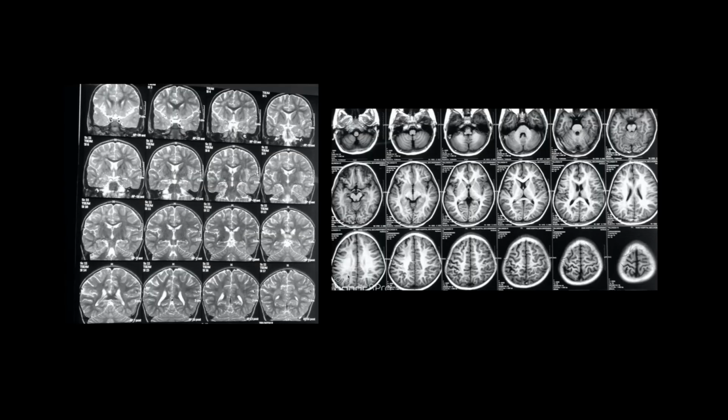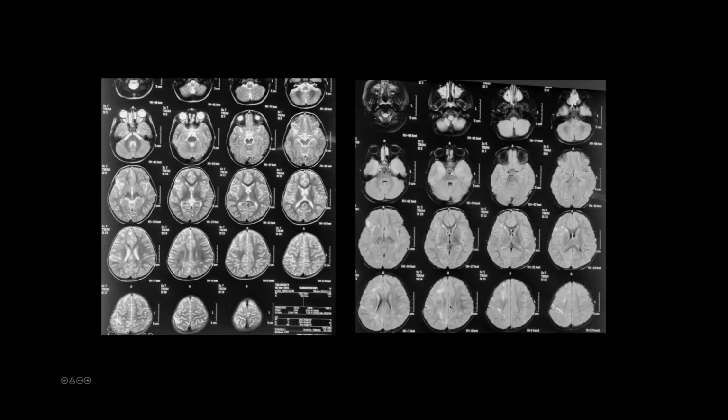Yeah, I think in the frontal there were some white matter changes, if I'm not wrong. On the left as well? I can't see that. If this is functioning or not, I'm not sure, but either way, acquired injury, ischemic or infective in nature. And I don't think you need to go around looking for a genetic basis on these cases. Okay. Only those cortical changes were a little unusual for any form of hypoxic or hypoperfusion injury. The frontal opercular region and the central region.